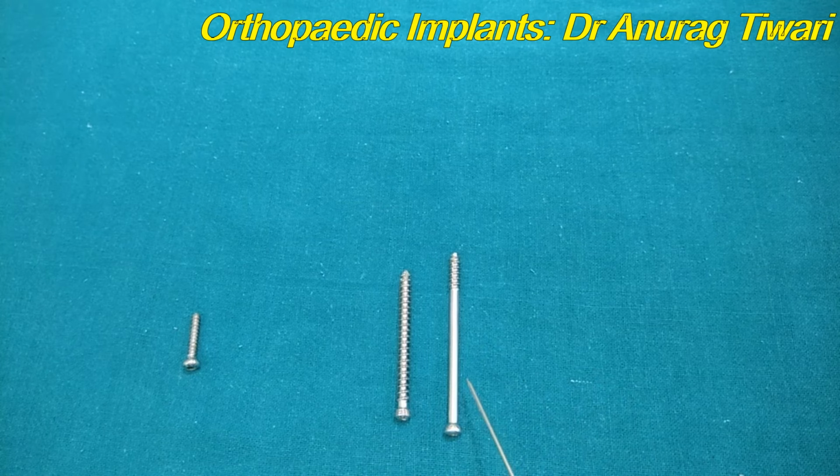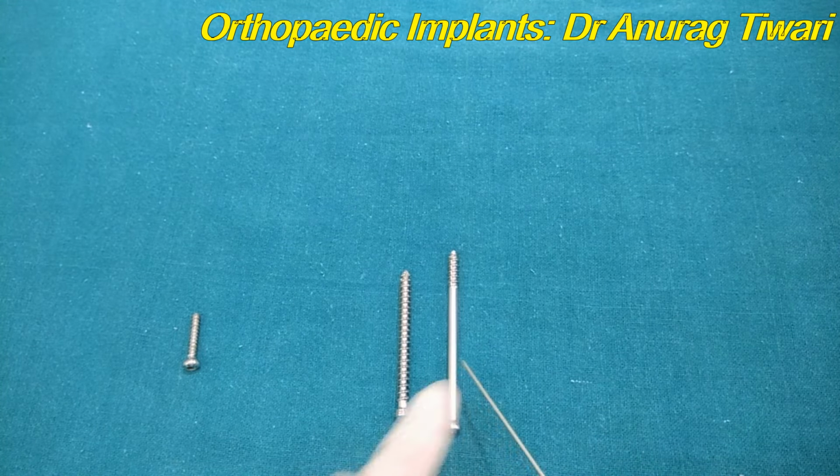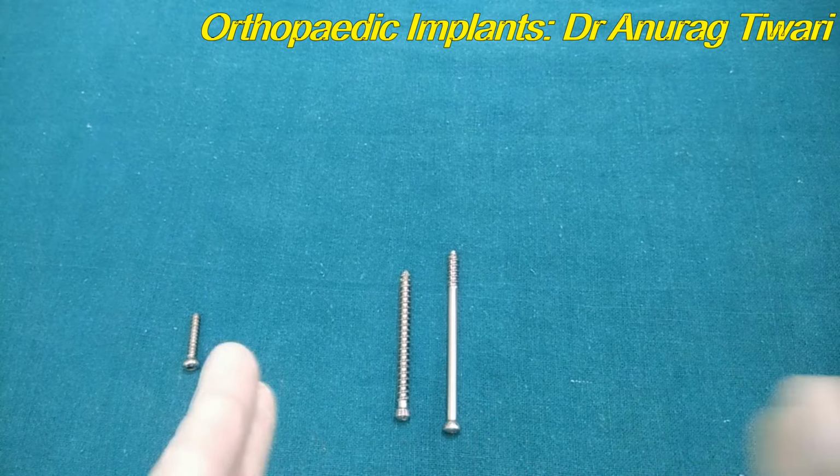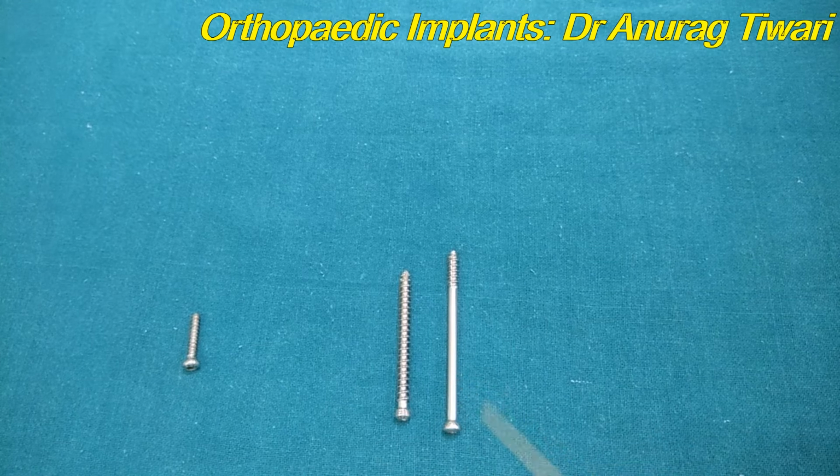Now the basic purpose of fully threaded versus partially threaded: the partially threaded screws are used as a lag screw for compression at the fracture site. For example, in fracture neck of femur and other places where we need fixation in compression mode.